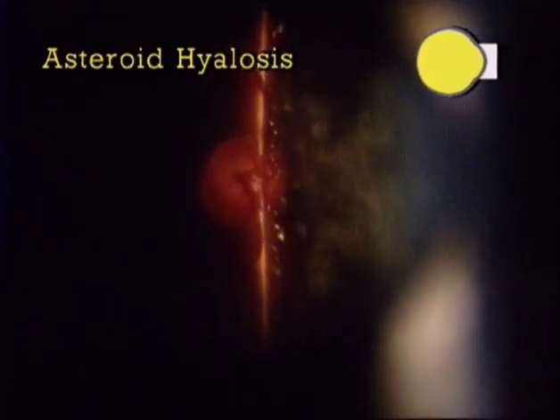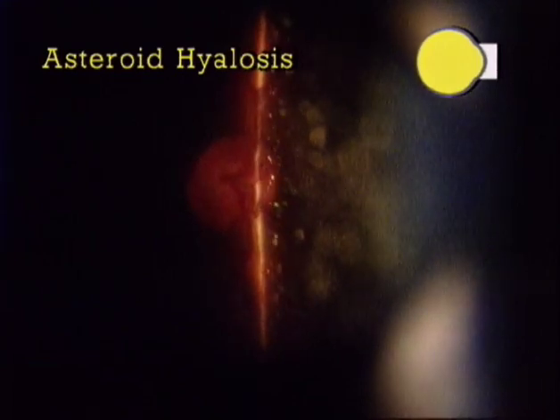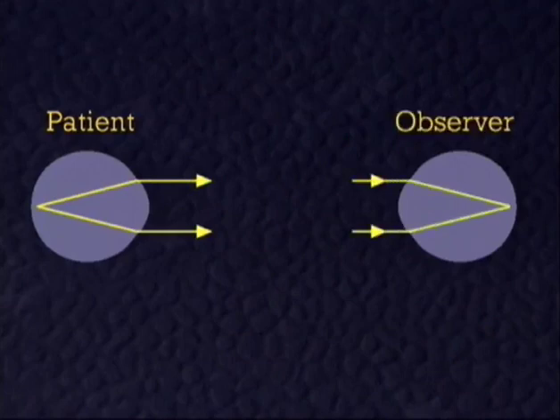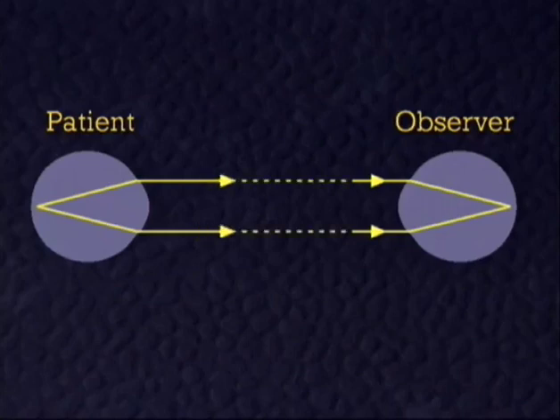Why is that so? Let us explain. The light rays from the posterior fundus emerge parallel from the eye under examination, and parallel rays are brought into focus at the retina of the observer's eye. Emitted and accepted rays coincide. This is why we can see the fundus in direct ophthalmoscopy.